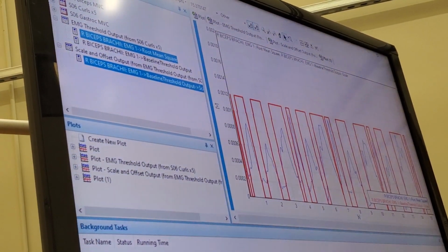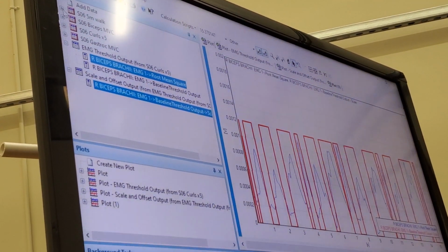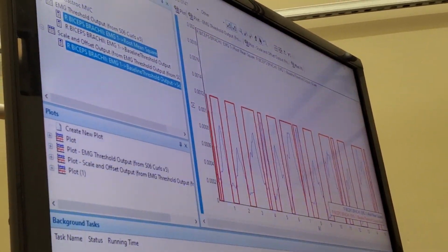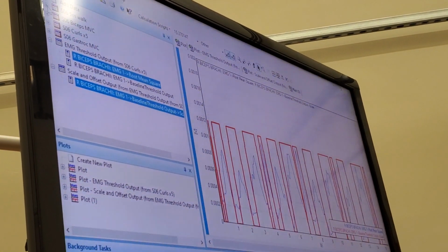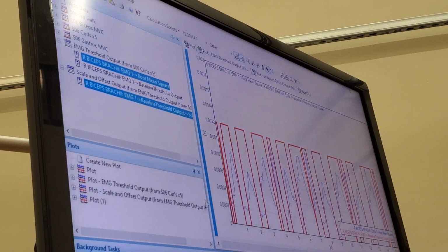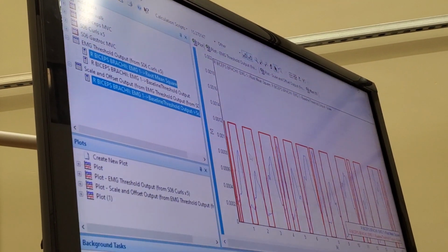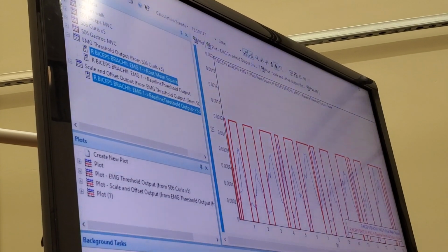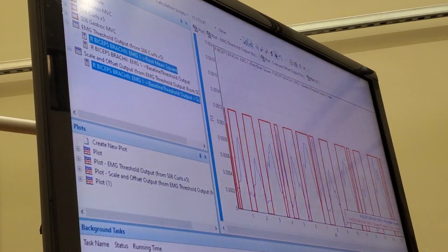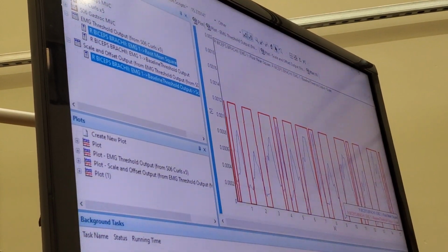It's not really an exact science of determining those settings. So a lot of times, up to now at least, I've had to just tweak it, play with it a little bit to get the activations that we're looking for. With this particular data set, I don't know if we're going to be able to eliminate some of this noise, because it looks like the amplitudes on some of those spikes are a little bit larger. So we'll see what we can do.